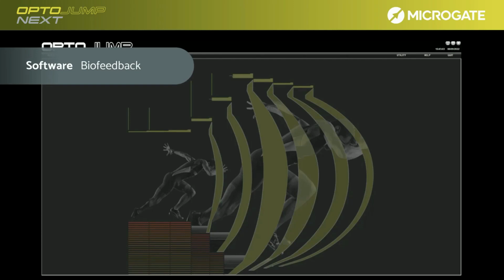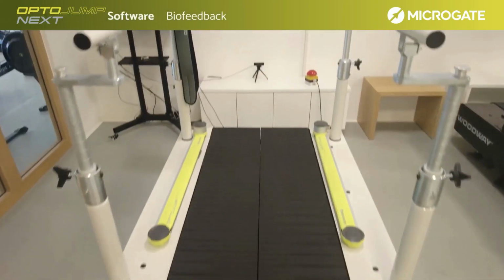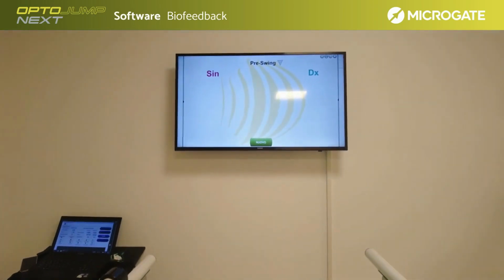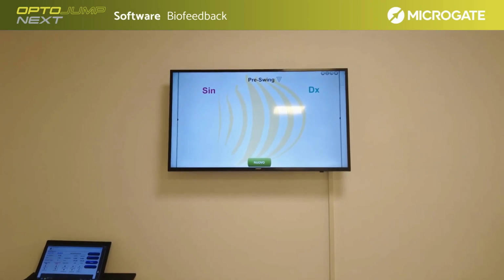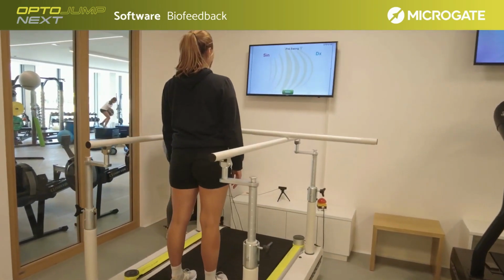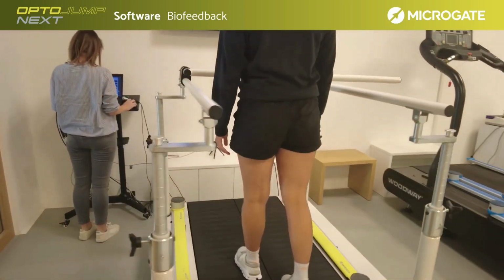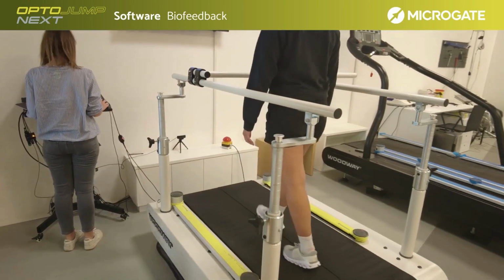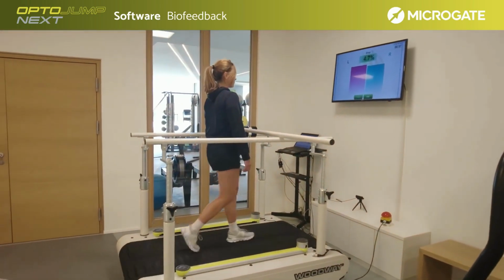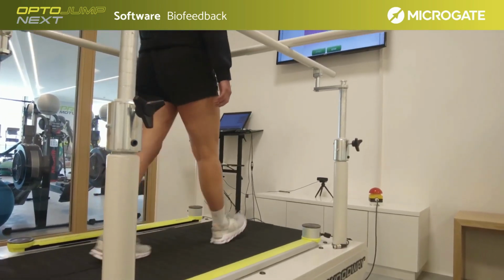On the biofeedback module, the athlete sees some basic test parameters in real time on a second monitor, usually a large TV or a tablet placed in front of a treadmill. The main difference between this and normal tests is that this is just a very fast start and run module with a minimal user interface, designed to be used directly by the end patient for minimizing asymmetry or increasing stride length. The patient trains and uses the system as a diagnostic tool directly coordinated by your own personal trainer.